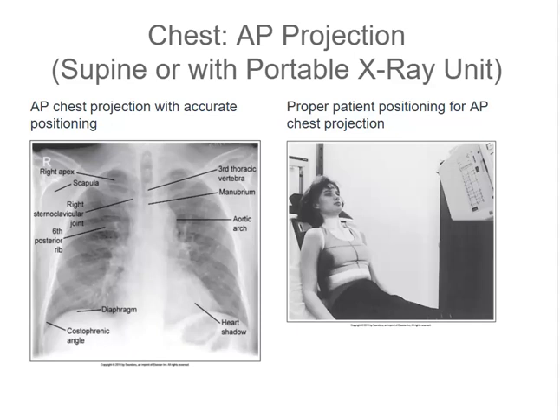The lengths of the right and left corresponding posterior ribs should be demonstrated as equal. The chest is demonstrated without foreshortening. The manubrium should still superimpose the 4th thoracic vertebra. There should be 1 inch of the apical lung field visible above the clavicles. Posterior ribs are demonstrated with a gentle superiorly bowed contour.